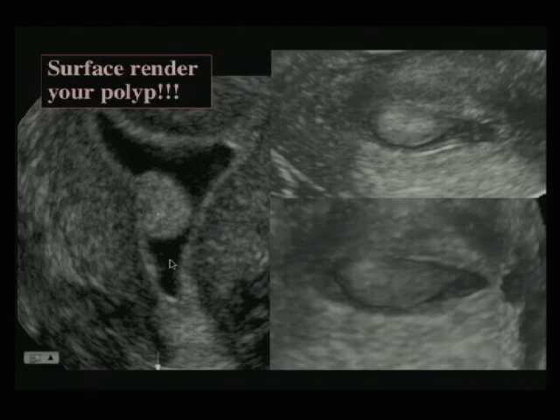Or you can then do the surface rendering of the surface of the polyp, and here we're seeing that surface. We're also seeing the surface of the catheter, which is right there, and you can take a look at that in the form of a virtual hysteroscopy, for example, sort of looking at the surface of the moon, if you will.